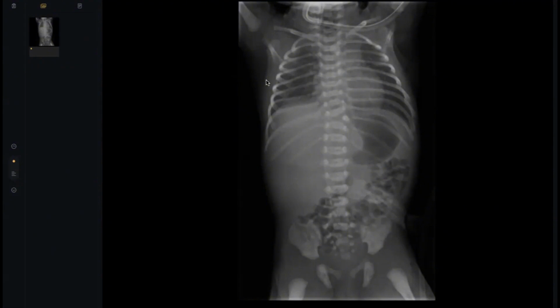I couldn't see any evidence of intestinal bowel dilatation. I can see evidence of the umbilical clips, so this is a neonatal baby. Also, I'm looking for any tubes. I can see something here, but I'm not sure about this. This is a tube. I couldn't see it well, but I believe that there is a tube here. With its tip, this one. Tell me, because the control is with me.